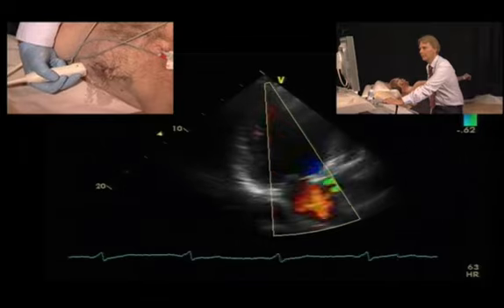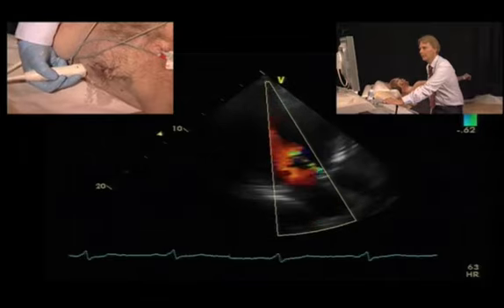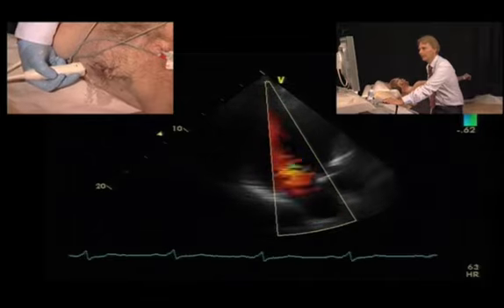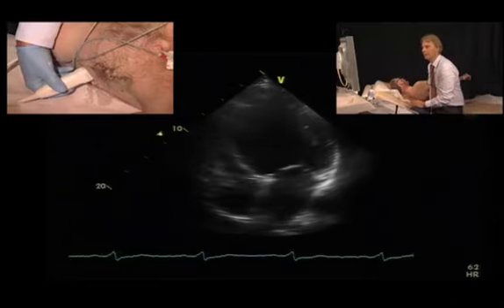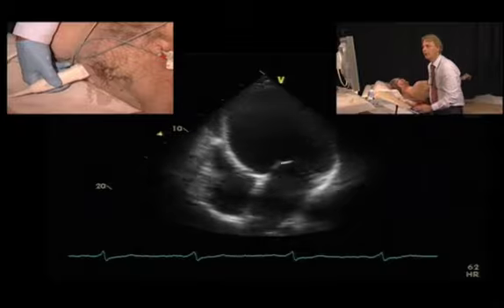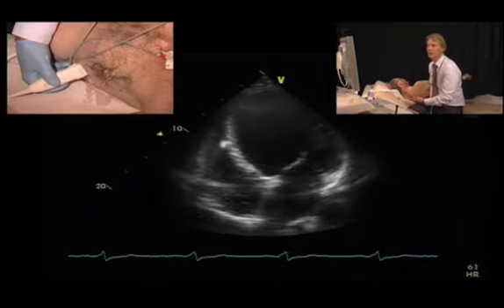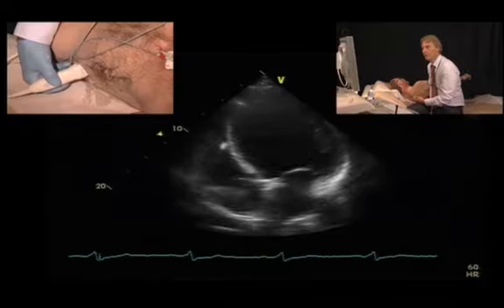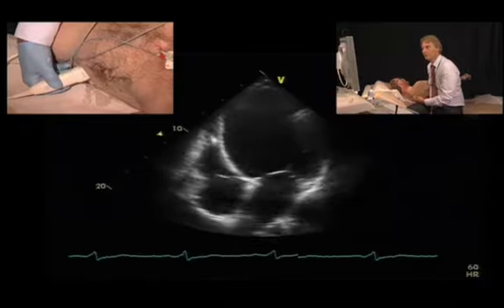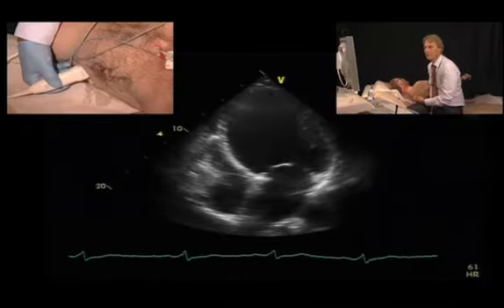So there is not much mitral regurgitation in this case, which is an important finding simply because it does show that the patient does not have additional strain on the left ventricle because of regurgitation. So there is no additional volume overload, which is an important prognostic factor also in this setting.